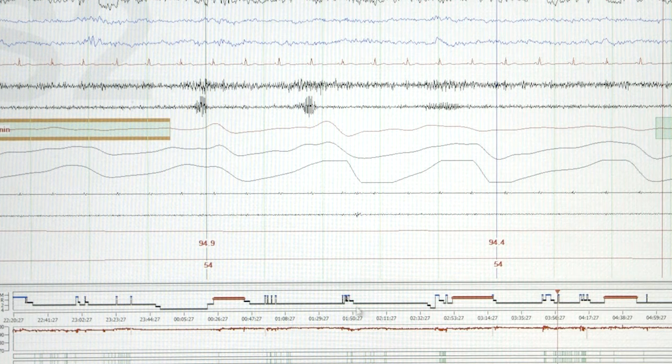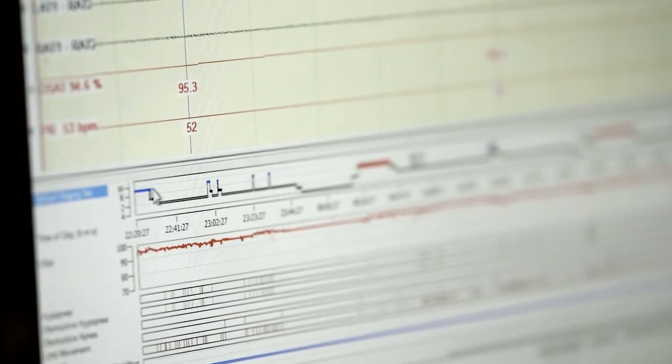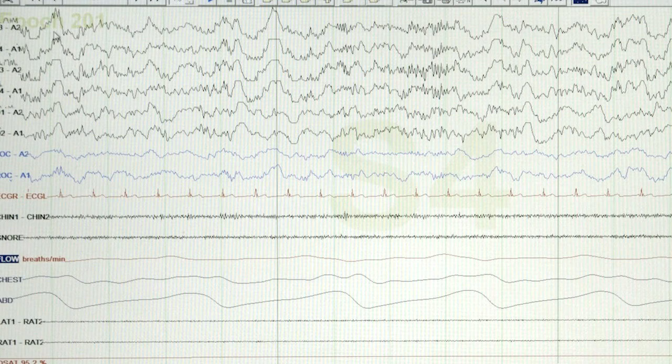This is your sleep stages over the whole night. Blue is awake, and you fell asleep in about 7.5 minutes. You went down to stage 1, which is pre-sleep, and then stage 2, which is light sleep. Then over here you went down to stage 3 and 4, which is your deepest, most restorative sleep, characterized by these tall, wide brain waves.